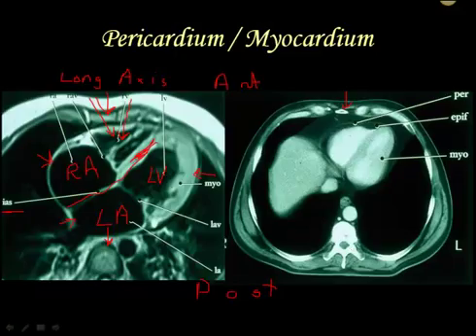On the CT that you see here, what you are looking at is further inferior than the image to the left. What you're actually seeing is the right ventricle and the left ventricle only, because we're further inferior. There is the septa right here. So that's all you're seeing down here at this point.